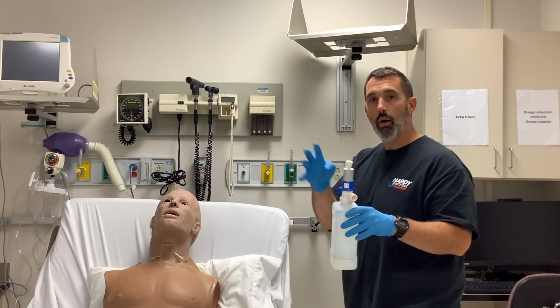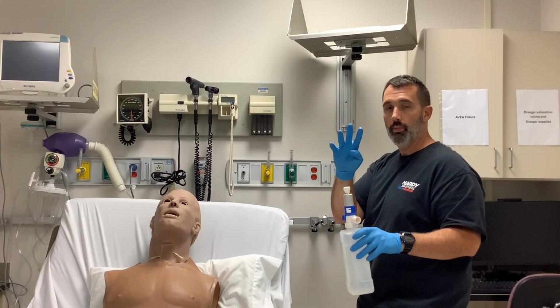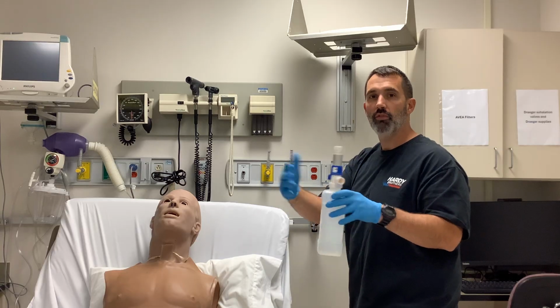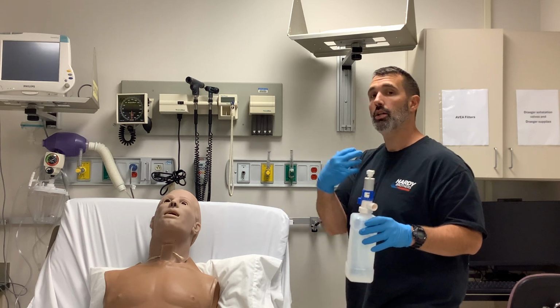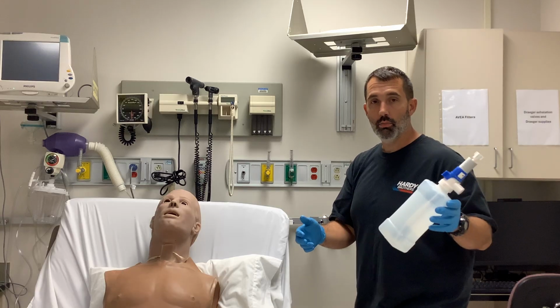That gives you a total output flow of exactly what I have set up right here, which is 4 liters per minute total. You have to have in excess of 5 to 6 liters to flush the exhaled CO2 out of a mask anytime you place a mask over someone's airway. And this kid had a tracheostomy collar. So I was glad that I was able to see it because it became a good teaching moment.